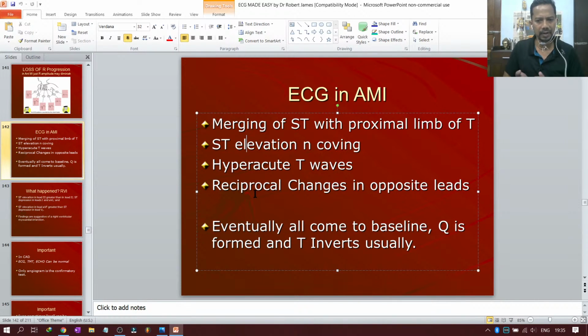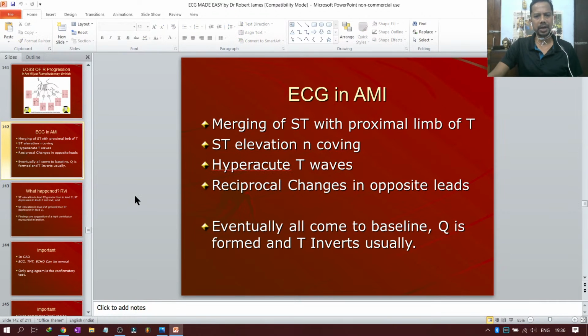The patient has had inferior wall MI plus he also has lateral wall ischemia, because many times we have seen patients come with inferior wall MI, we thrombolize them, and after 2 days they develop an acute anterior wall MI. So this keeps on happening. Okay.